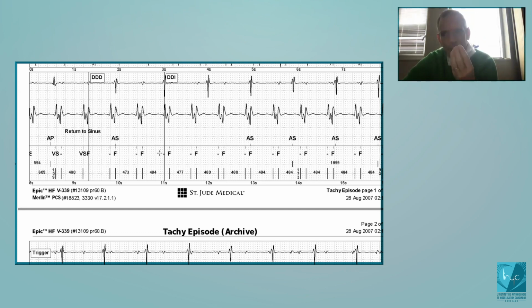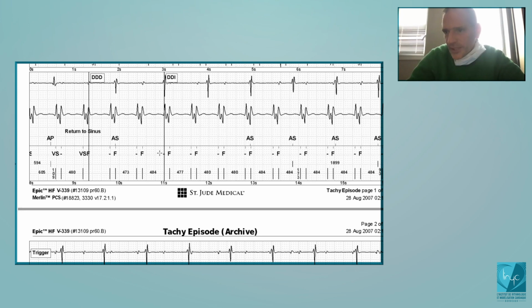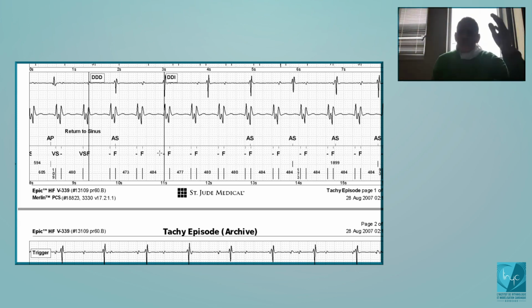So, first of all, if you consider T-wave sensing and R-wave double counting, in some companies there are episodes like this, and in some there are not. For example, for T-wave sensing, for different reasons, you will never see it in Boston devices, but you will see it in Abbott or in Medtronic devices. Biotronik has nearly completely corrected the problem of T-wave sensing in the new platforms, but you still see some T-wave sensing in Abbott or in Medtronic.